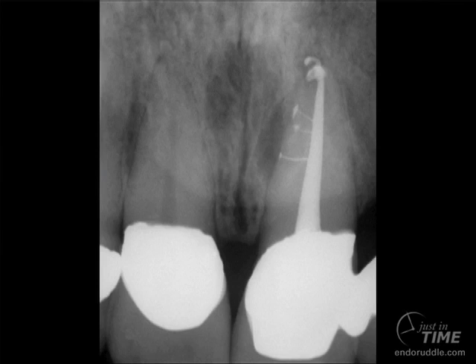Well, post-operatively, you can see that we have eliminated the silver point. We have a nice dense fill, and you can see then that there's some surplus apically, but there are 3 significant and important lateral canals. And notice these feed the lesion of endodontic origin. And the puff is at the portal of exit. So there are 4 portals of exit on this single-rooted tooth.